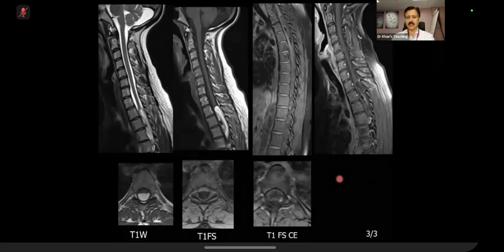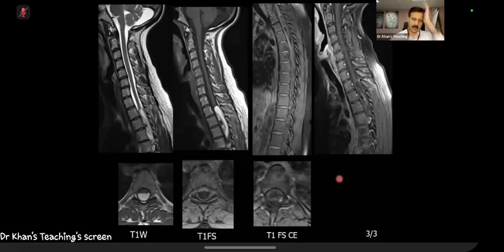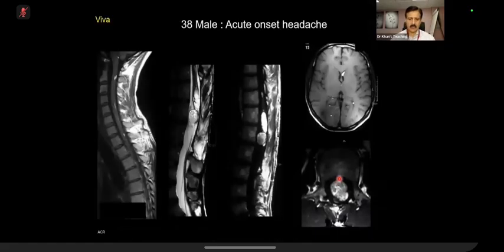But other people think that at times some enhancement might be seen in a dermoid, but most people think that this might be a teratoma. Teratoma per se is not an exam case. The point is that if you pick up a fatty thing, that's fine, because teratoma will have multiple other layers also. This is the type of scenario which will come in the exam.